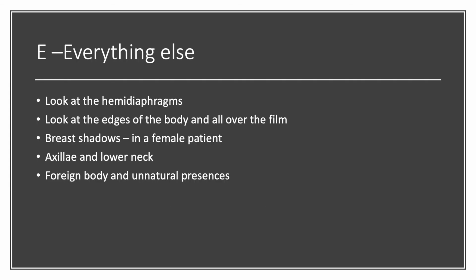E stands for everything else. Look at the hemidiaphragms, specifically for air under the diaphragm. Normally, both hemidiaphragms peak in the center, and the right hemidiaphragm is higher than the left due to the position of the heart. Other intra-abdominal pathologies you may see are areas of calcification under the right hemidiaphragm, which may represent gallstones, and dilated loops of bowels under the hemidiaphragms.